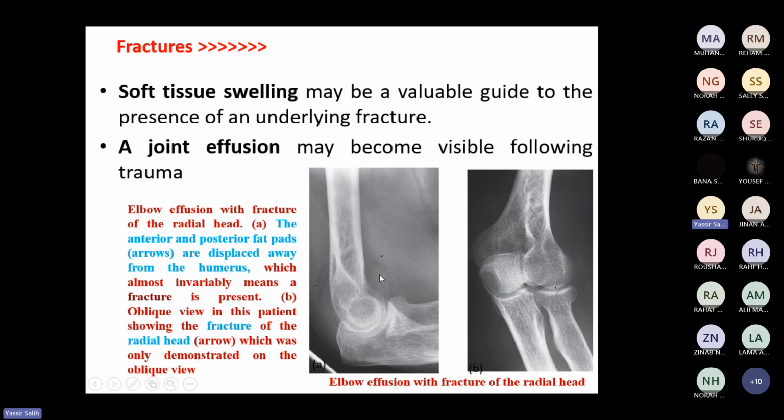The presence of this effusion is indicating that there is a fracture. لذلك you have to look at the bone very carefully. You have to review the X-ray for this patient presenting with trauma to diagnose the fracture. لكن till now in this lateral view there is no obvious fracture. لكن presence of this positive fat pad which indicates effusion, it is a strong indicator for presence of fracture. So you have to review this film carefully, and if you do not see the fracture, you have to order or request other views. This fracture may appear in other views.